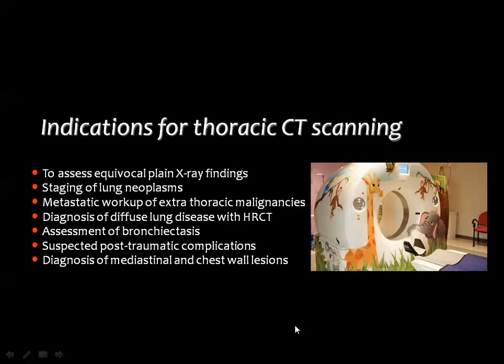So I will emphasize the essential needs for the CT scan in the pediatric age group whenever we are examining the chest, and I will show to you the value of the chest X-rays as well as the value of CT whenever it is indicated.